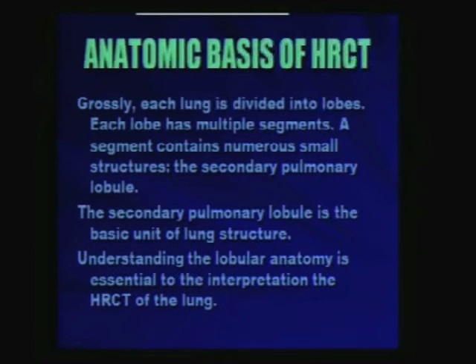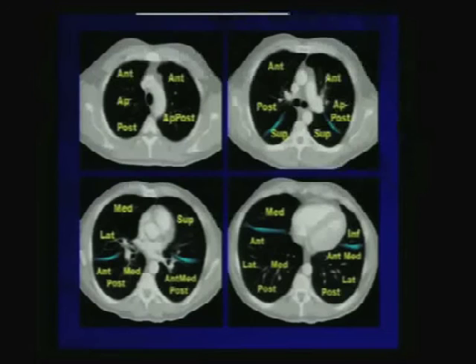If you look at what we display in the lung parenchyma on the CAT scan, you're going to see this uniform appearance of the lung parenchyma filled with air, and then you have bronchi and vessels, both pulmonary arteries and pulmonary veins. They are better seen in the central portion of the lungs, but as they taper toward the periphery, they become smaller and fade away into the periphery. And then you can recognize the fissures and so on.